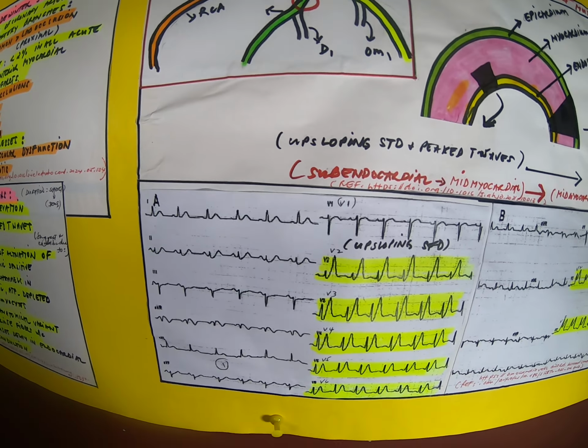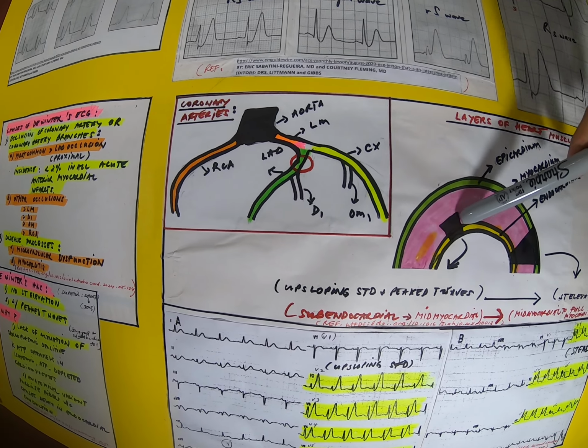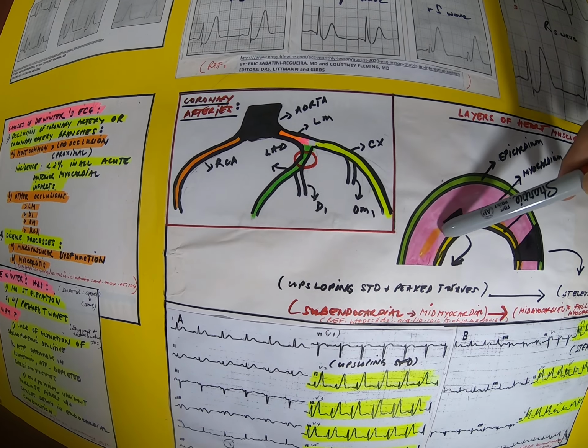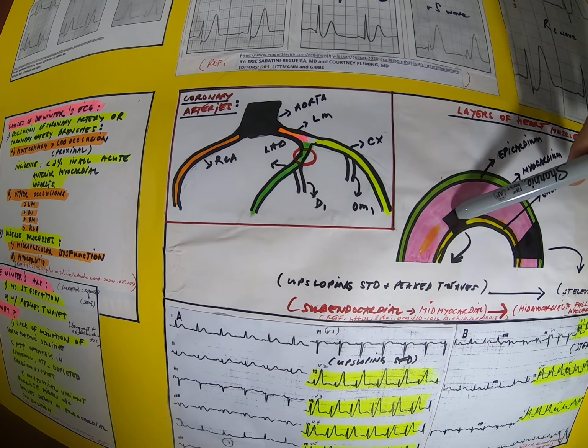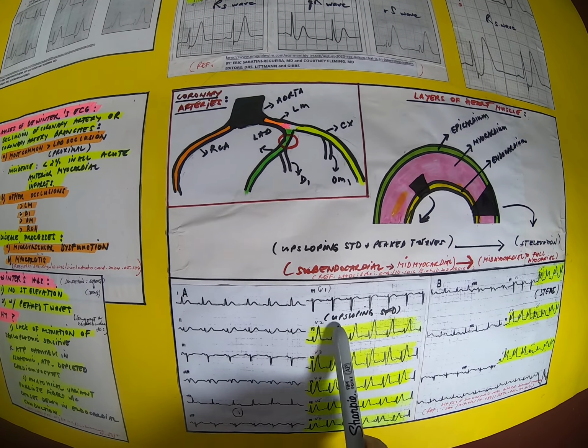So I went over some reading materials. Now this is what one reference would say. We have a subendocardial myocardial ischemia or infarction that expanded and began penetrating the myocardial area. So from the innermost layer, you start going up to the myocardium, but partially. And that probably explains all these peaked T waves in here.